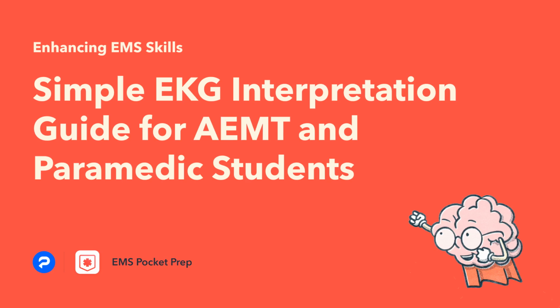Understanding and interpreting electrocardiograms is an essential skill for AEMT and paramedic students, as it plays a critical role in diagnosing and managing cardiac conditions. We're going to simplify the process by breaking down the key concepts and providing practical tips for accurate electrode placement and EKG reading. Let's get started.